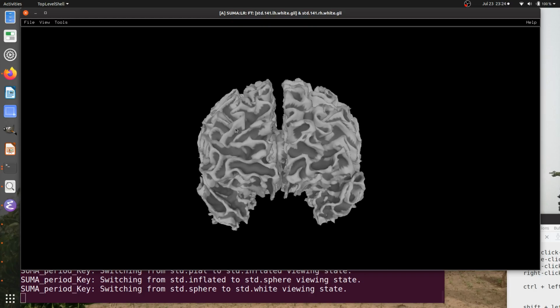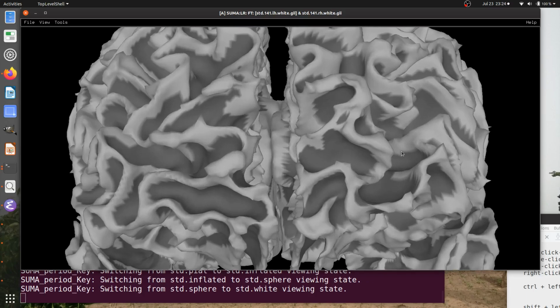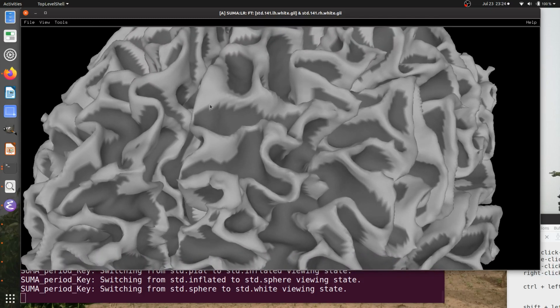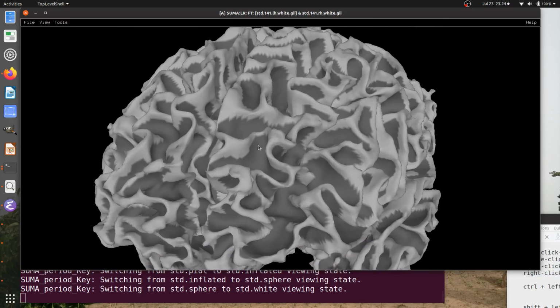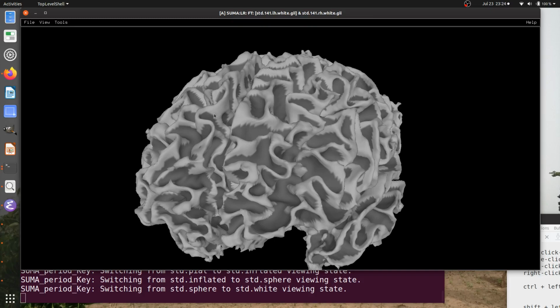Okay, now let's take a little bit more of an investigation at what our mesh is here. It really looks smooth, but if you notice here, there's this kind of jaggedness to this coloration here. Well, what's happening there? Why is that? What are we looking at? We might think that this is a nice continuous and smooth object, but on a computer, really nothing is. So what happens now if I right-click somewhere on this surface?